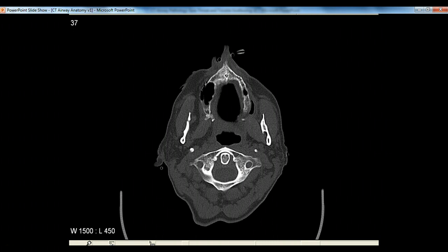So, and then in the center of that, right here, we've got your odontoid, and that's a bony structure that comes up from the second cervical vertebrae, and you can see it comes into the first cervical vertebrae, and that allows the neck to rotate and the head to rotate around the neck at that point. Now, just a little bit posterior to that, you can see the spinal cord. So it's in the spinal canal, but that bone shares that space.